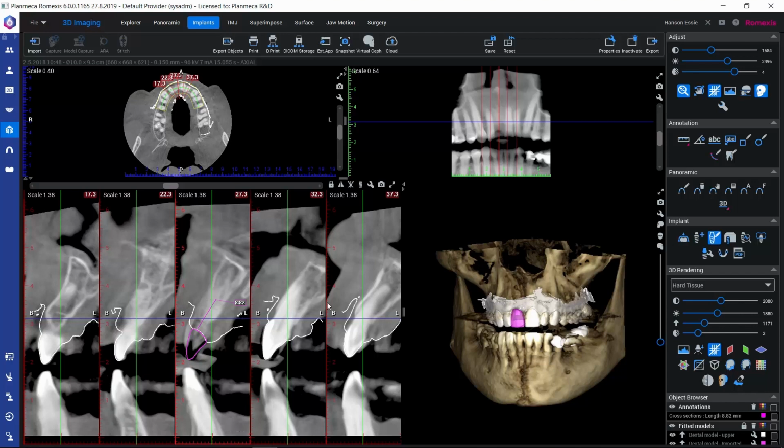When we activate this tool, we can keep our left mouse button down, and at the same time, like we see when we are defining the dimensions for this generic implant, we can also see those dimensions displayed next to this rectangle. So this tool will always produce this same kind of generic implant, and it will have the dimensions that we specified while drawing it.